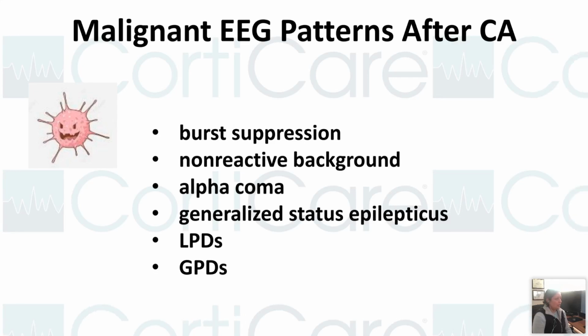Keep in mind, in patients after cardiac arrest, some of the patterns are malignant. The prognosis will be poor in those patients. Burst suppression is a mix. It can be a good or a bad prognosis. We'll discuss after a couple of slides.